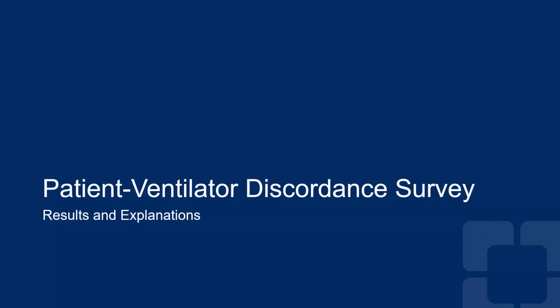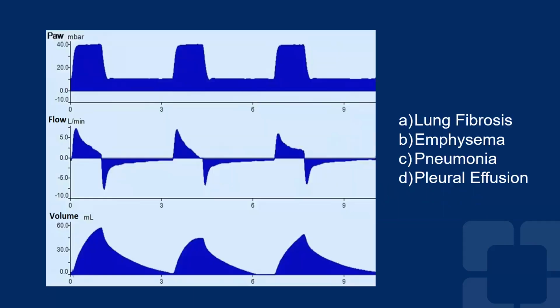Now, this is governed by what we call the time constant. And for any respiratory therapist or ICU practitioner that cares for patients on ventilator, we need to understand the time constant. This is the description of the amount of time that it takes for the volume, the lung pressure, or the flow to change 63% if you're inflating, 63% for each one of the time constants.